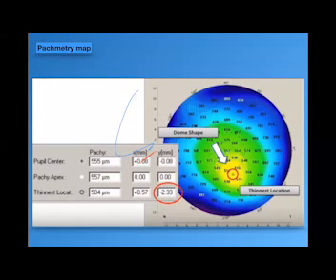If less than 465, even a normal cornea, don't go for any ablation. Think of another option like the phakic IOLs. So the thickness, 490 or more, flap; PRK down to 465. Okay.